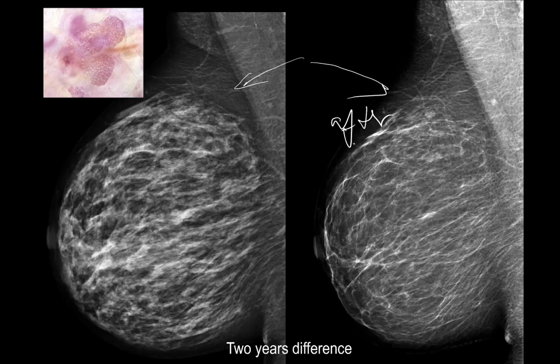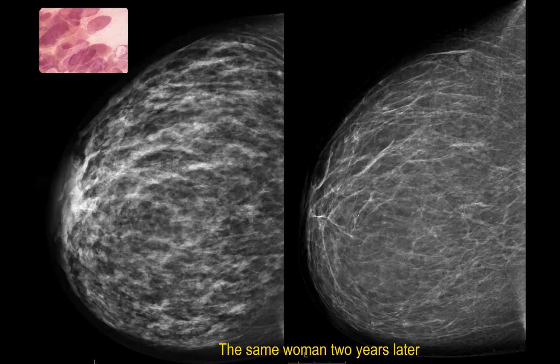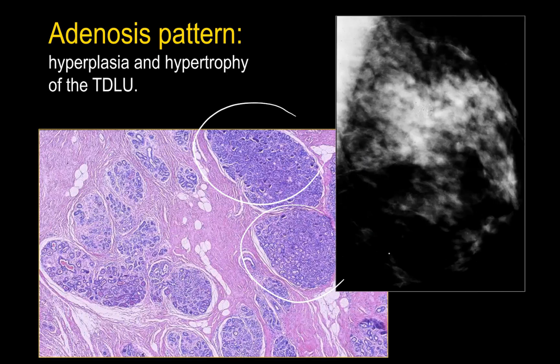Before or during lactation and after lactation. Look how beautifully we can read physiology out of the mammograms. Mammograms are very sensitive images of the underlying three-dimensional histology. If it's simple adenosis, so not the pregnant, but she was born with it, she will never get rid of this pattern. And that's sad. She will always have these big, big nodular densities.